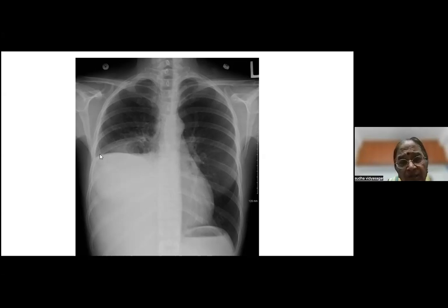Then you look at this shadow, and you've got your bronchovascular markings here. So you can't call it a pneumo. It's probably a consolidation involving the mid lobe, and probably there is an effusion. That's why the diaphragm is also not seen. You can neither see the right heart border nor the diaphragm. It may be an effusion, but then it has to be a strange effusion. It doesn't really have an Ellis curve. It's nicely cut off there, a flat line. So you would vote for a consolidation, given the total lack of shift of anything. Okay, let's go on to the next one.